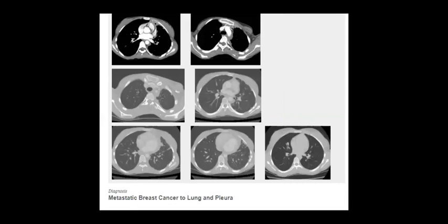Okay. I was preparing to go through the images in the cases on the basis of systems. So I will show you, for example, our first scope today is to start with head and neck again, but with the view of hybrid imaging. So let's start with this case.